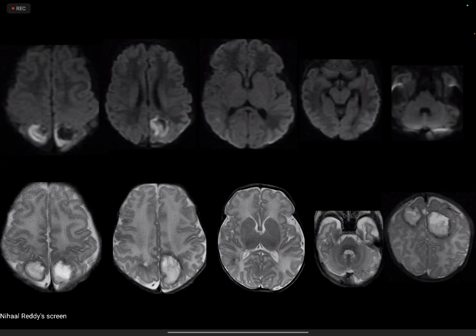So near that confusion which I had, you mentioned the diffusion restriction. Obviously, that should also show some degree of blooming, which is not there. That's odd. I thought it was searched for something else other than blood over there. Yeah, because I agree, that's something which confuses: you've got a part which is restricted, but there is no blooming in that area. So is that pus or is that some protein-rich content? That was the question. Tej, what do you have to say on that?